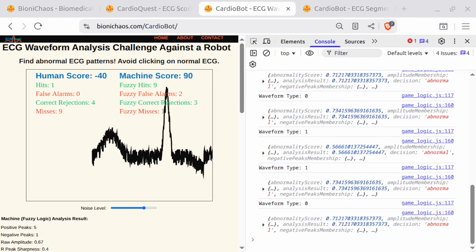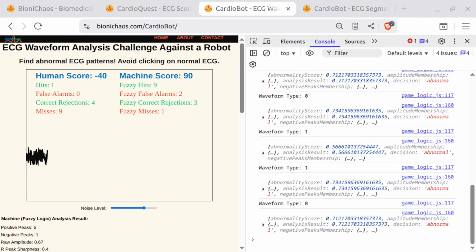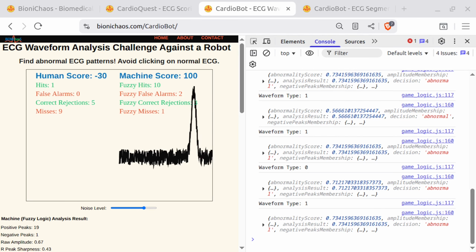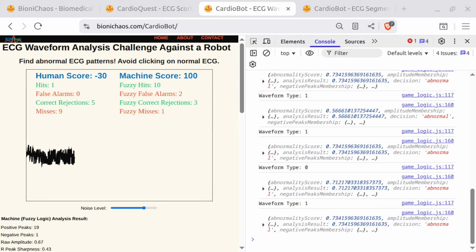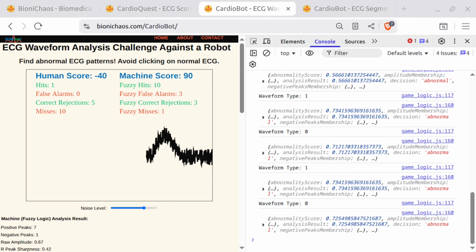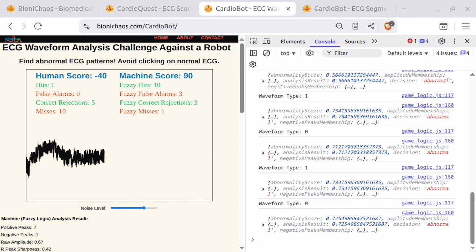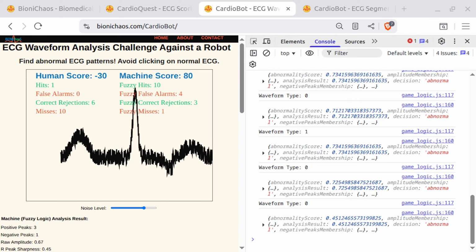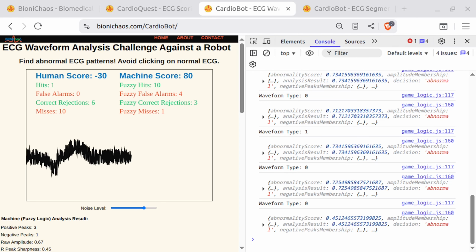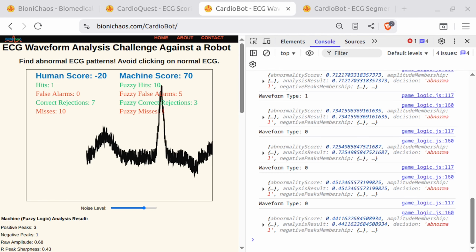That was the bug, the click tolerance. The AI had set the acceptable click radius to 1 data point. On a full width canvas, that's literally a single pixel. A single pixel? Of course. It's not a medical training tool. It's the world's most frustrating carnival game. Step right up, folks. Test your might. Can you find the one magical pixel on a sea of 2 million? You have 5 seconds before our lightning-fast robot does it for you and takes your quarter.